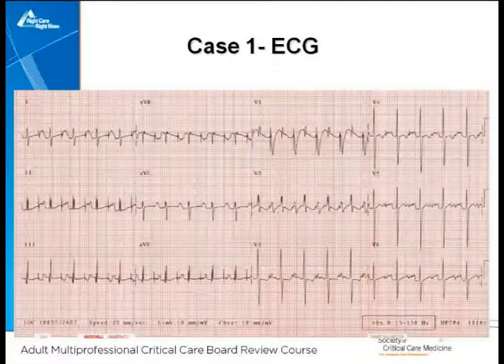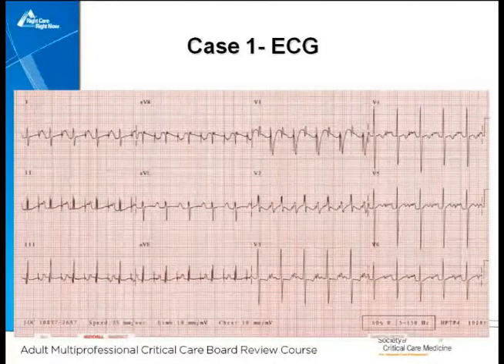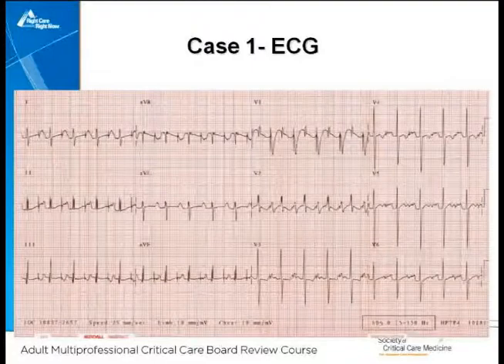So this is a boy who had some heart surgery and has a giant atrial activity or a giant P wave when he's atrially paced. And then his QRS in the same lead is normal or is smaller. But if you look over here, if I gave you just lead 1, you'd pick it up. This is a P wave that looks like a QRS. So you always have to use the cardiogram, use all the information, not be fooled by what catches your eye first, and recognize how the cardiogram is recorded with everything just coming up there like that.